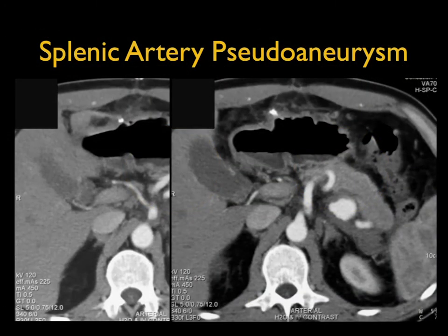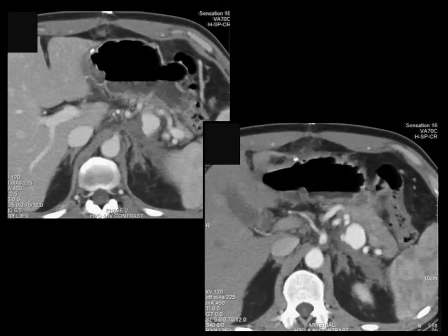Now, sometimes I've seen cases like this one. This patient presented elsewhere. The patient had a CT scan, showed blood, but no reason. Patient came to Hopkins. He was a physician. But you can see here, how did they miss that large pseudoaneurysm? Well, what happened was the pseudoaneurysm was compressed by the blood, and so now with some of the blood resolving, we were able to see it. This was embolized and the patient went home.